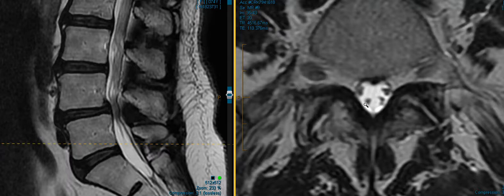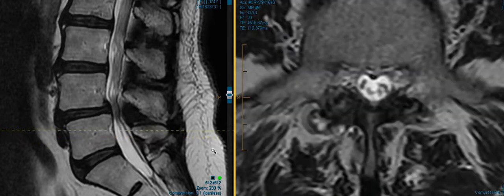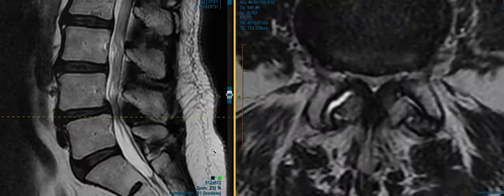They're free-floating, perfectly happy. As I scroll up to this level at 4-5, we're going to see something change there. And you'll notice that you can no longer see the nerve roots. You see some arthritis from these facet joints on each side pushing in, a little bit of bulging of the disc. And that space that was much larger and allowing nerves and spinal fluid to pass by is now just barely allowing the nerves to get through. So they're really pancaked in there. That is called stenosis.